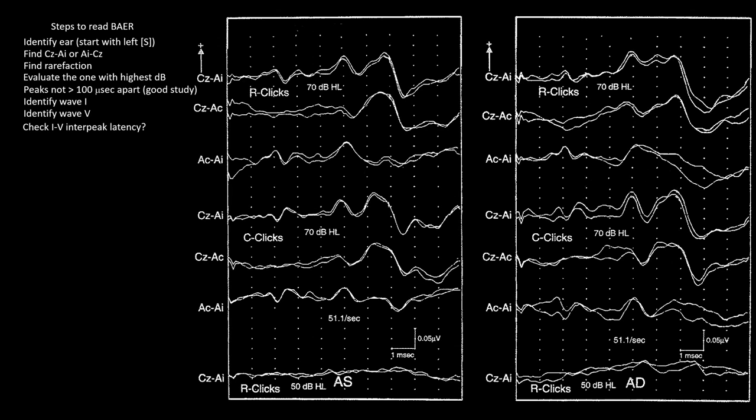As you can see, I have transported these items, that is the item that you have just read, from the master chart to the side of this frame that also has the panels presented in the question. So let's start. The first step is to identify the ear to be analyzed first. Most electrophysiologists start with the left ear, which happens to be the one addressed in the initial question. Remember, S stands for left.